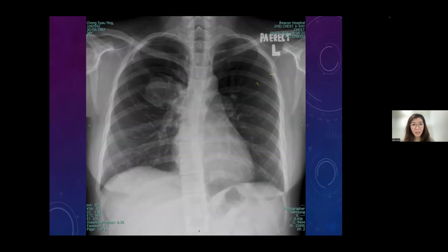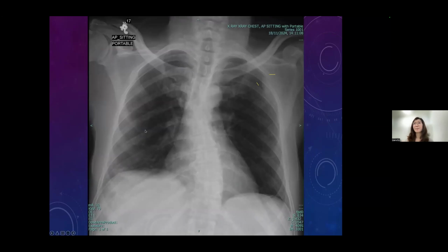We are lacking time. I want to show you. Okay, this one. Come, okay, guys. Come on. Last one. But you all did very well today. Yeah. Okay, you got it right, the X-ray just now. Come look at this. All of you said kyphoscoliosis. Okay, good. But there's something else I want to show in this X-ray.